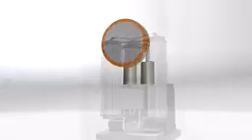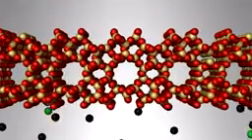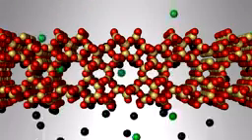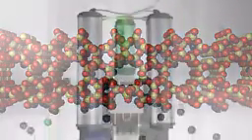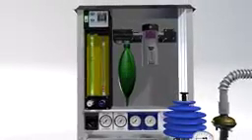Air is drawn into the UAM and is purified by two different filters. The compressed air passes into a canister filled with a powdered material called zeolite. Nitrogen sticks to the zeolite, while oxygen and other gases flow through it to a reservoir tank. The UAM produces up to 10 liters per minute of oxygen. The oxygen then travels through the flow meter into the back bar and reservoir bag.